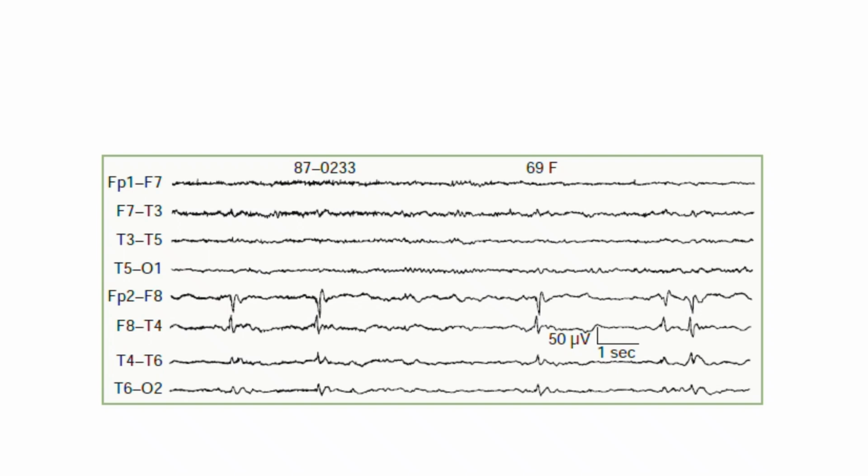Notice that the left hemisphere channels look completely clean, showing normal, low voltage background activity. The pathology is strictly confined to the right hemisphere. 2. Identifying the phase reversal at F8.